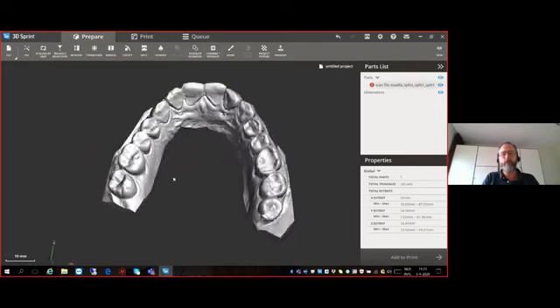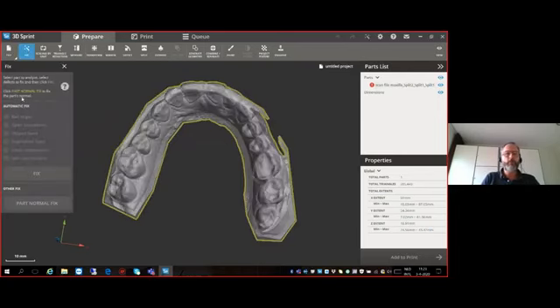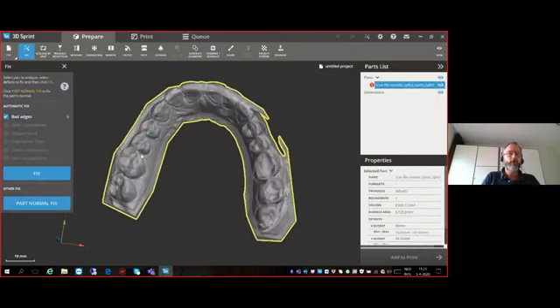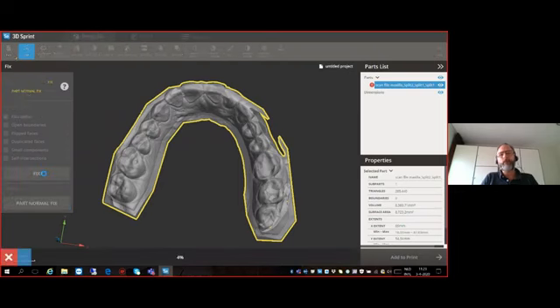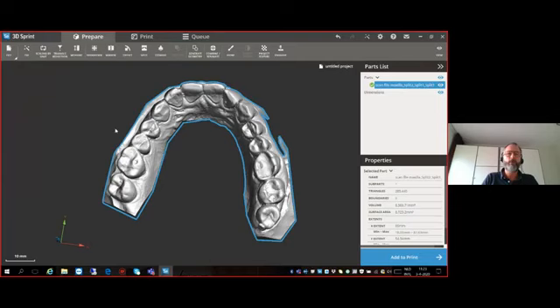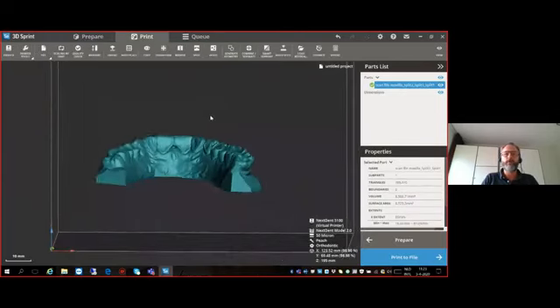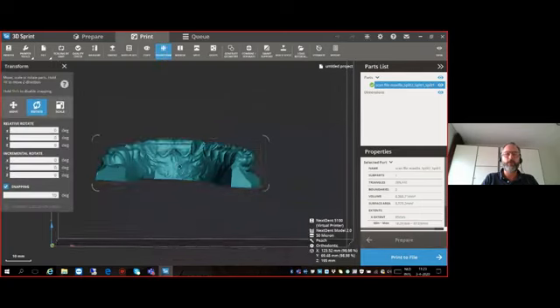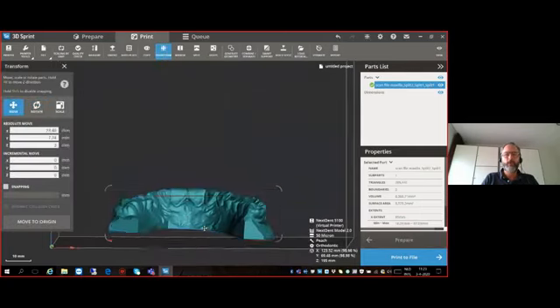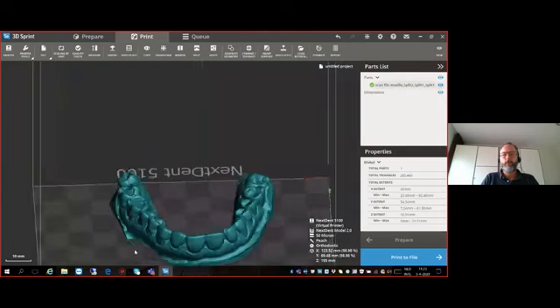You might have seen that the part by now is turning yellow. So again, we have to go back because of the things that we've done. The part is not really printable yet, but you can see that now it's turned blue. We can go back to the printing. We could add supports, etc. Of course, after orientating the part, supporting it, and then we could print.